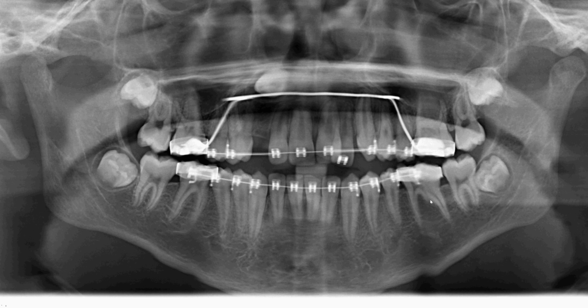It's a little blurry here. The pulp space becomes a little blurry and becomes sharp again. And here it just has that band of area that looks blurry. So what could be the reason? I don't think I had a chance to cover this in some of my lectures, so I think it would be important for you to see that and recognize.